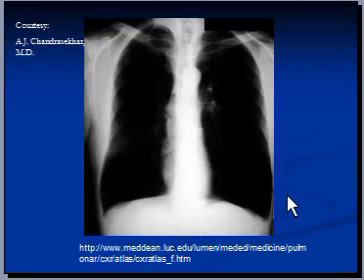Nowadays, however, we do digital X-rays, and you would be able to see the lung tissue a bit better because of the manipulation you can do to the X-ray. This is a non-digital image, however.